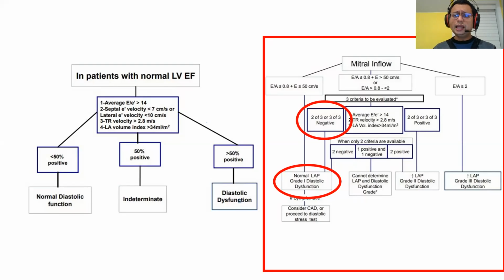Why shortness of breath then? Remember, in the stem, the shortness of breath is on exertion. So exercise the patient. When you exercise the patient, you can catch diastolic dysfunction that occurs in exercise. All right. Let's go to our next case, guys.